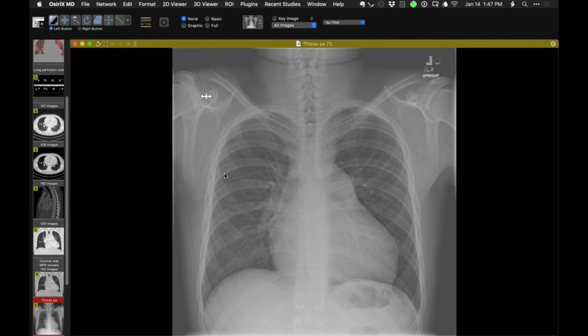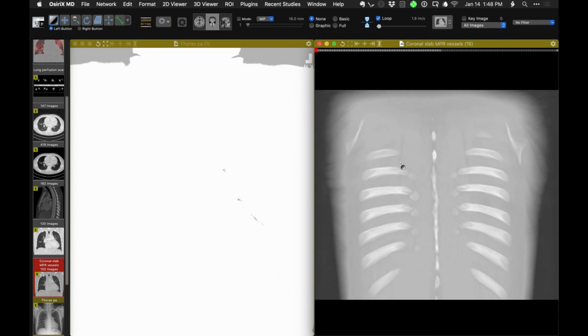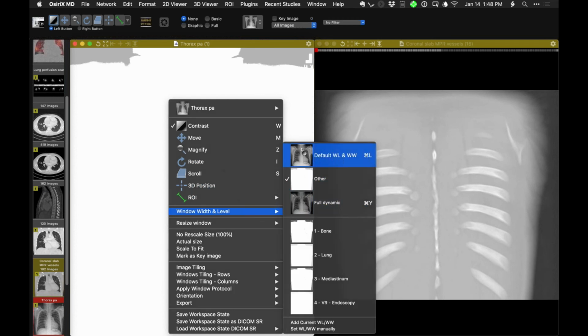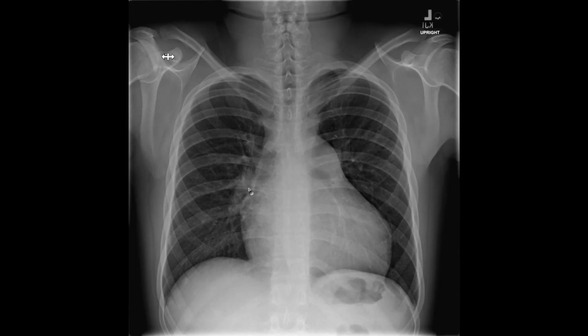And usually I say, well, we need to go a little bit further, because if you analyze the pulmonary vessels, you may be able to take it a bit further. So then I usually teach at least 3 things. Inversion of pulmonary blood flow, chronic pulmonary venous hypertension. Then what Eric Milne called the balanced distribution of pulmonary blood flow, when the vessels in the lungs, arteries, and veins are distended and of the same caliber in the upper and lower lung zones. That goes along with a left to right shunt.